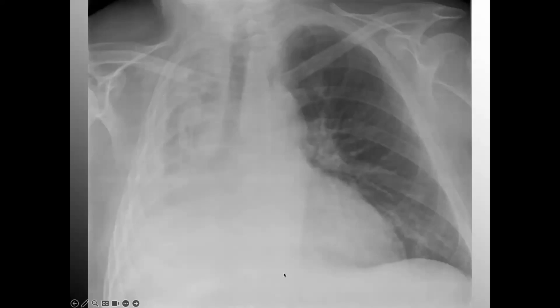If I look at diaphragm, I've got diaphragm here, no diaphragm. E, everything else. Cardiac, I've got this side, not this side. I've got complete whiteout on most of that right lung. Could it be a pleural effusion? It's very possible, but more than a pleural effusion, which fills the space with fluid instead of air, most likely I have a massive atelectasis, an almost complete right lung collapse.